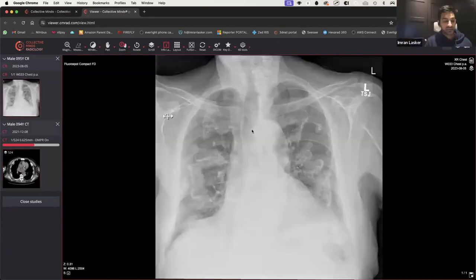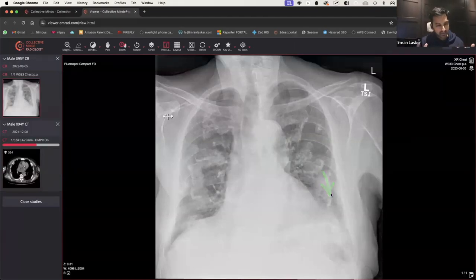And I remember when I first started radiology, or even when I was a junior doctor on the ward, this used to scare me, like, oh my God, they've got cancer. But that's not generally the case. If it looks like this, and they actually say they look like holly leaves, I think that's the way they describe it, like these kind of zigzaggy leaves all over the chest. And sometimes you see them kind of curve round the side, and that's because they're pleurally based.